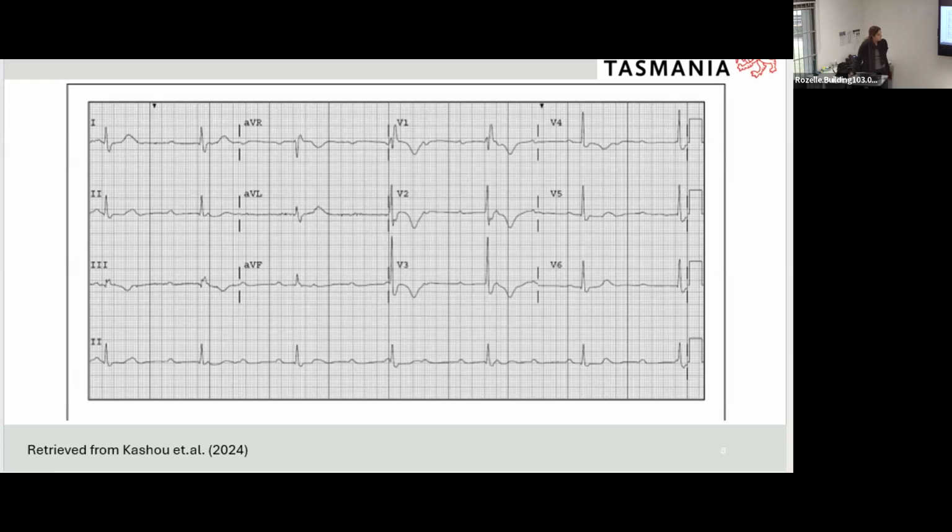Michael, you've said the 6-second method. How do you go about that one? Sorry, count 6 seconds on the strip, which is 1, 2, 3, 4, 5, 6, looking at lead 2 down the bottom. Yep. Count the QRS complexes and times it by 10. Perfect. What's the good advantage of that method? It can be used if it's an irregular rhythm. Yeah, for sure. And especially for us when we're trying to interpret things a little bit faster.